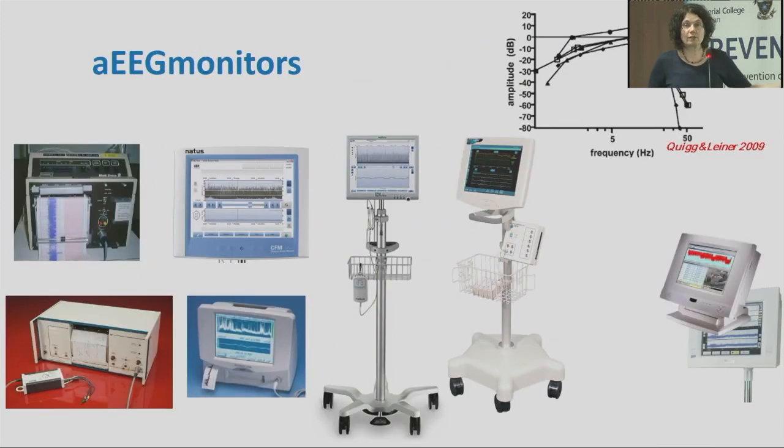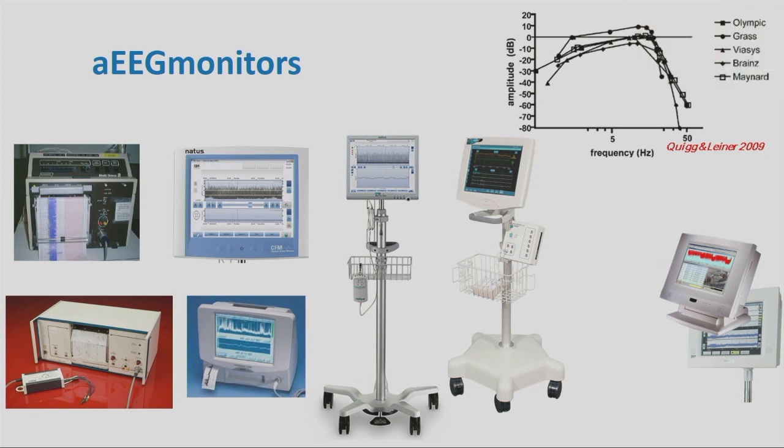There are lots of different monitors available, and the only thing which is important to remember is that all of these tools use a slightly different paradigm to derive this signal. So what you can see here is that what they display is slightly different. So you need to get used to the aEEG you are using, because they all display the signal slightly differently.